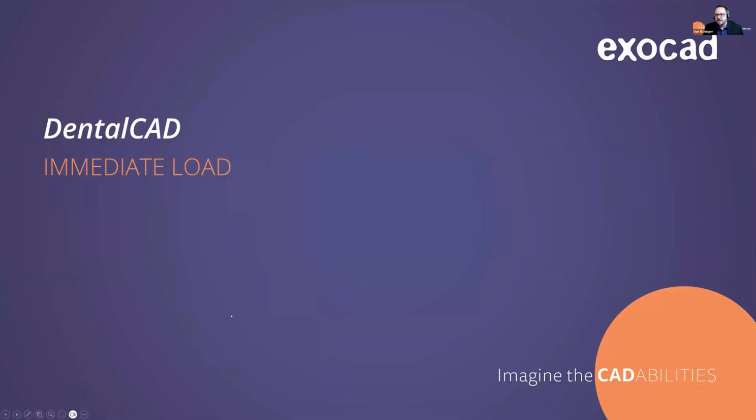A great thing about the software solutions we offer is that after you finish the planning process with ExoPlan, you have a quick, easy way to utilize immediate load functionality. We can import that project directly into our DentalCAD and provide a temporary restoration for day of surgery.